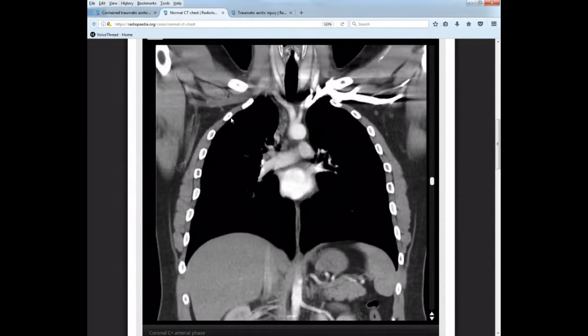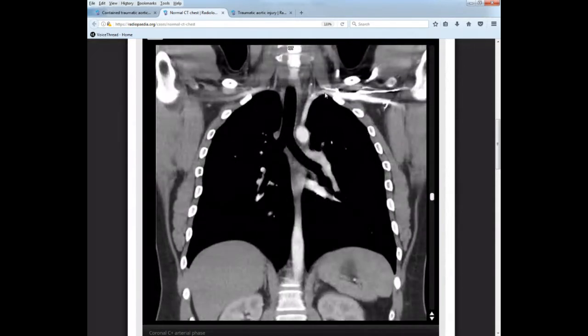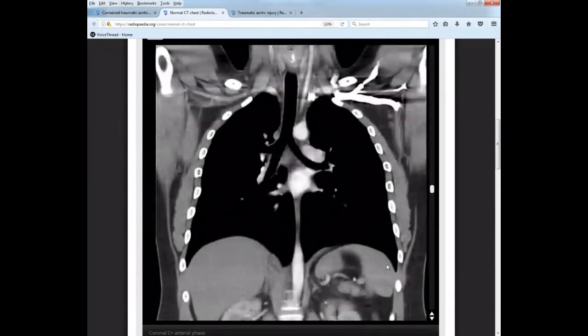In a soft tissue window, it's not really easy to see a lot of lung anatomy, and it's especially not easy to see the pleural linings, which we'll talk about in a second. We'll definitely be able to see pleural linings if there is something that's occupying the space between the pleural lining, the parietal pleura, which is the lining that lines right along the outside of the thoracic cavity. And then the visceral pleura lines right along the lungs, or the viscera, in the thoracic cavity. So if there's nothing occupying the space between the parietal pleura and the visceral pleura, you're not going to see it.